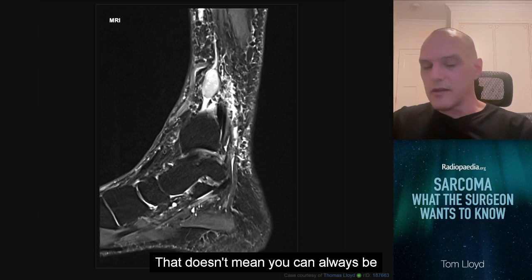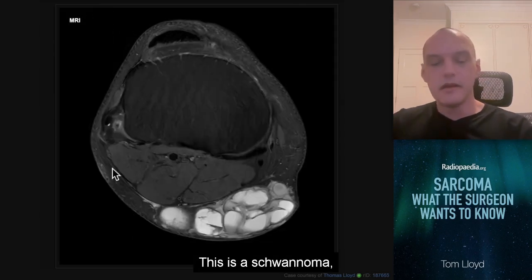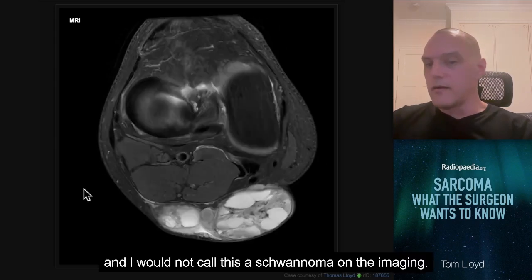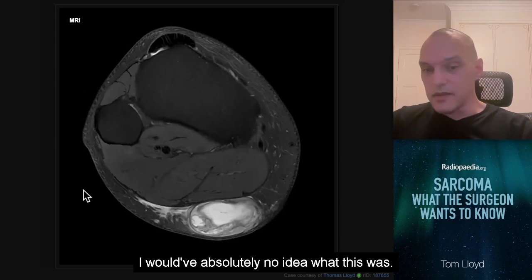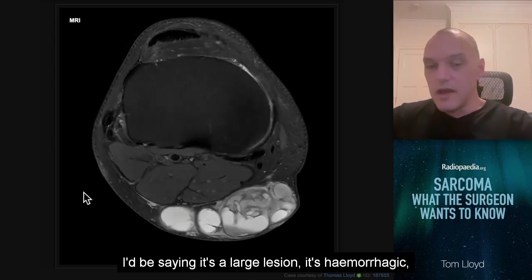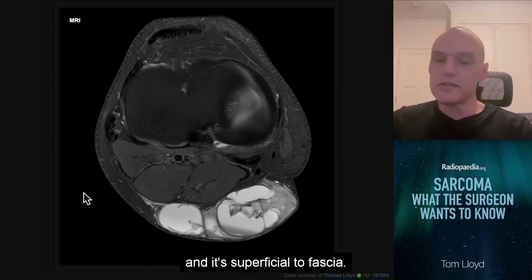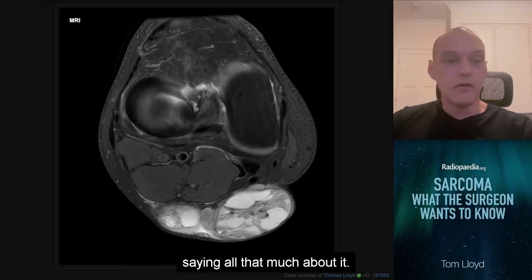That doesn't mean you can always be confident with these tumours. This is a schwannoma, and I would not call this a schwannoma on the imaging. I would have absolutely no idea what this was. I'd be saying it's a large lesion that's hemorrhagic, it's greater than 5 centimetres, and it's superficial to fascia. Beyond that, I probably wouldn't be saying all that much about it.